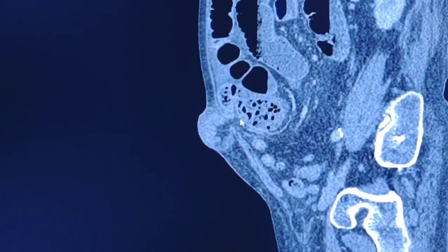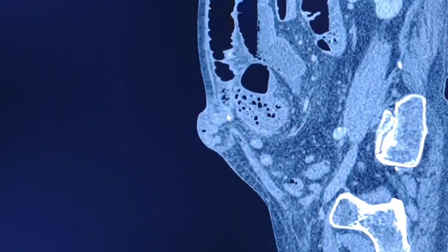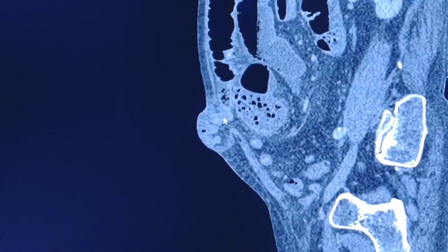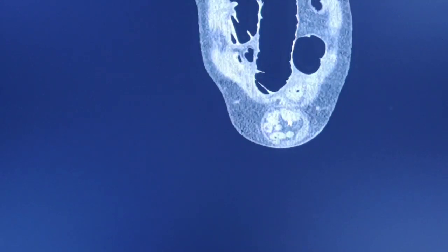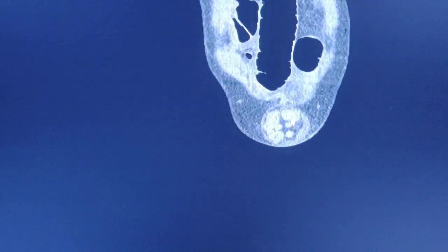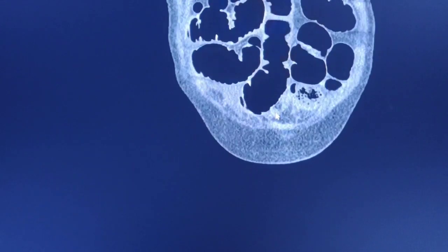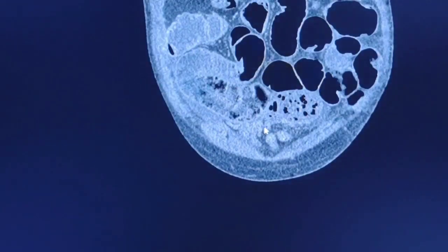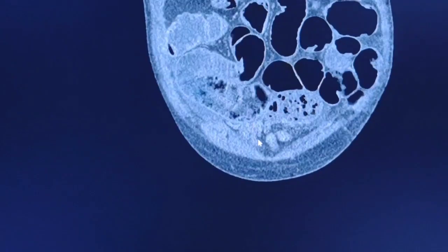Now let's go to the umbilical hernia, and we can see a stenotic point at this region here. And probably in coronal views it's much easier to see the bowel loop contained in the hernia. If you look on the right side, you can see the collapsed part of the peripheral small bowel, which is here. As you can see, these small bowel loops are collapsed. This is the peripheral part.